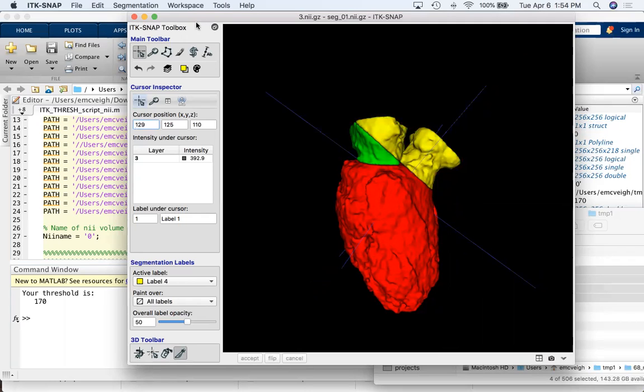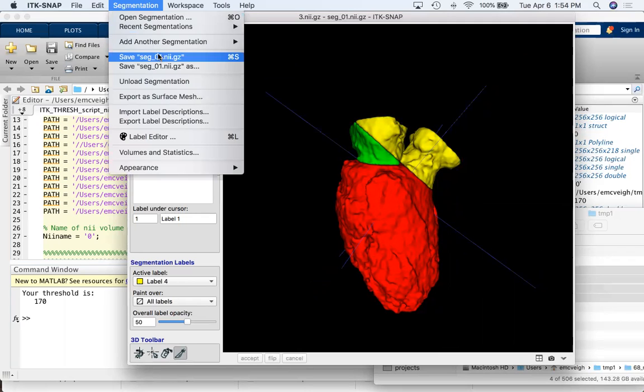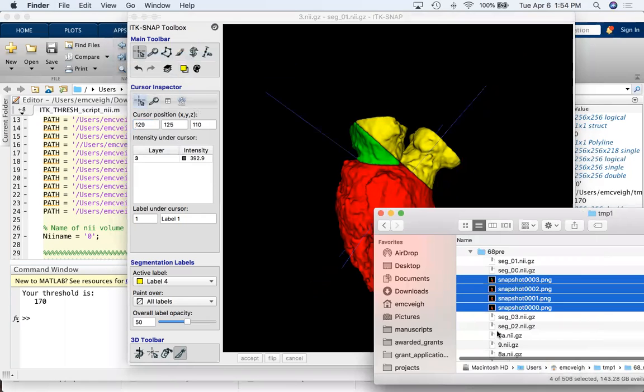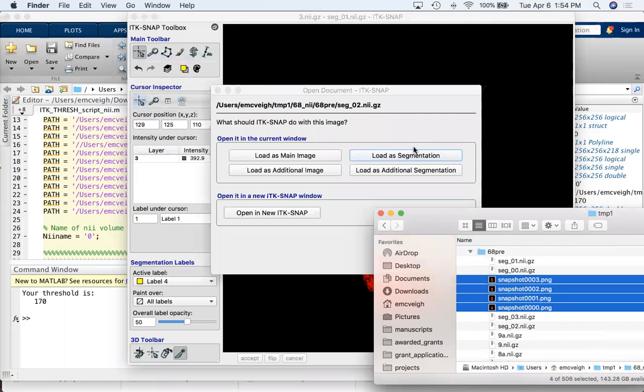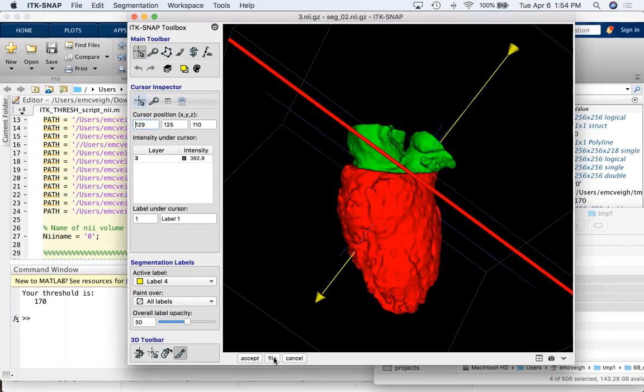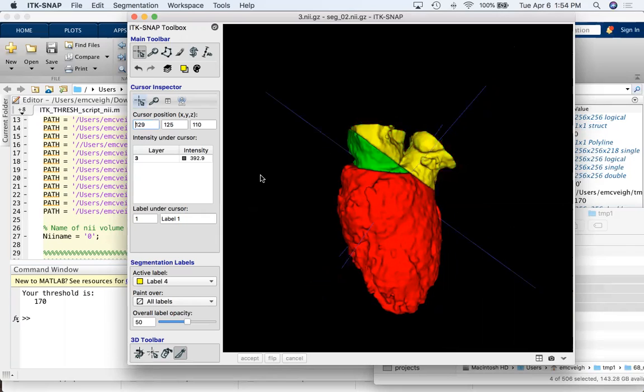Do that as 1. Drag 2 in. 2. It turns out it's not that super duper important that these are perfect.